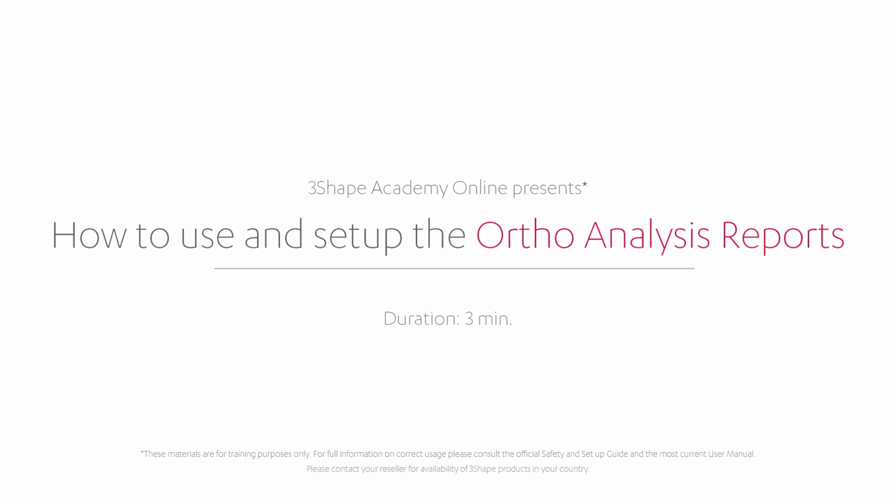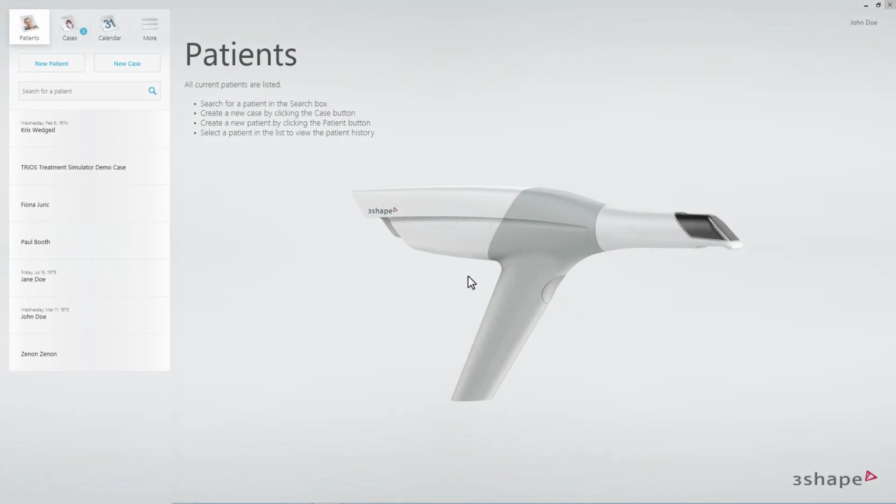In this video, you will learn how to use and set up analysis reports in Orthodontic Planner. Also, you will learn how to customize your logo in the reports.